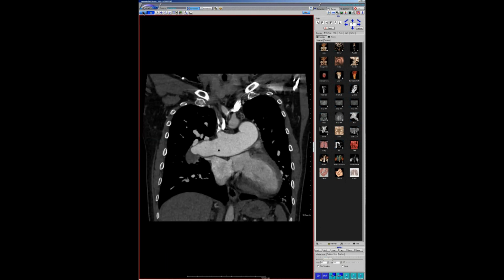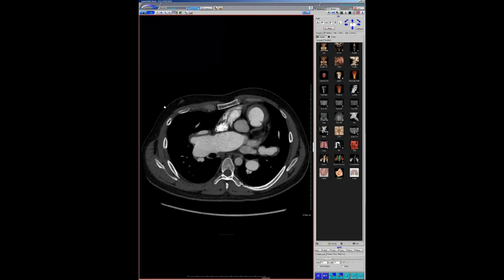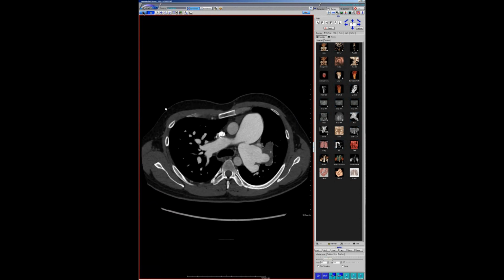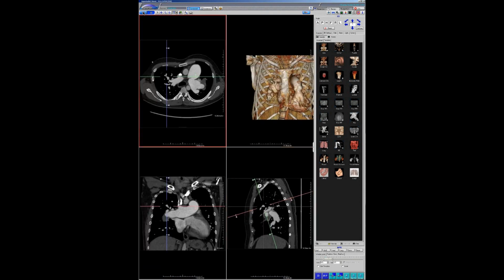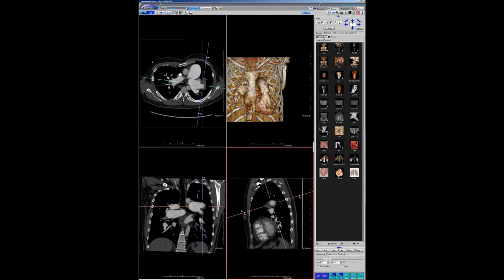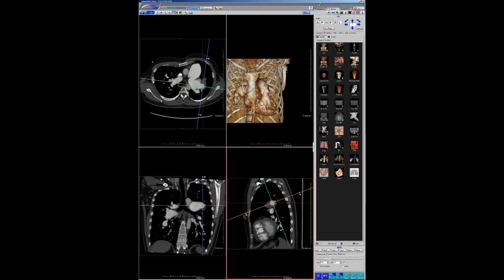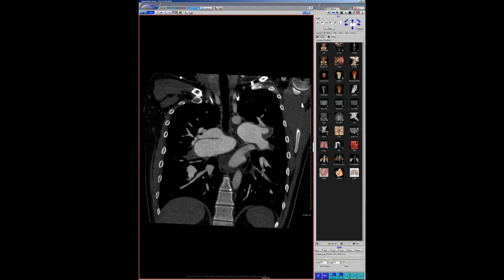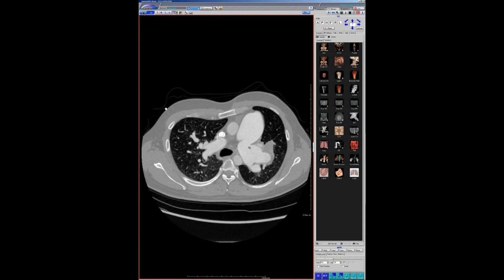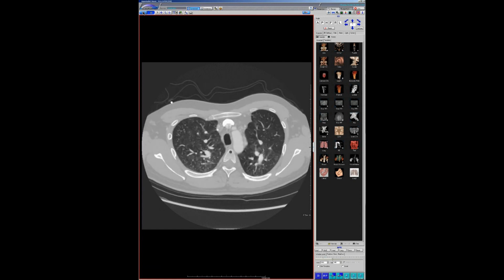there's no vessel here. So there should be an artery that's supplying this region. And I wasn't sure if it was this really tiny ramus, but I presume that there was an occluded either vessel off the ramus or an occluded OM that we just couldn't see. You can almost see a hint of it here. Anyways, so this was a post-radiation case. You can see in the lung the radiation field, and you can see also the RCA is about as pristine as it gets. He also still has his tree-in-bud nodularity. So this is the most severe case of radiation stenosis I've seen in a young patient.